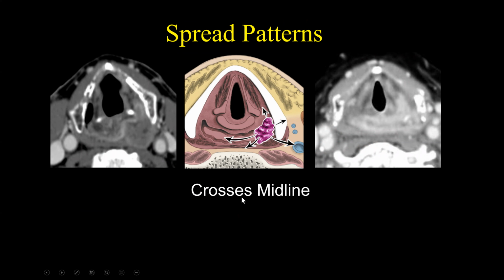One thing we have to determine is whether or not this crosses midline, because if this does cross midline, then it's either going to be involving the posterior pharyngeal wall or the post-cricoid area. So if this piriform sinus carcinoma crosses midline, it involves a second subsite, and this upstages it to a T2 lesion. Similarly, as we'll see later, if the tumor crosses midline, it's also going to change the potential primary echelon nodal drainage. Piriform sinus carcinomas that are lateralized are primarily going to drain ipsilaterally, but if these tumors cross midline, then all of a sudden the contralateral lymph nodes become at risk.